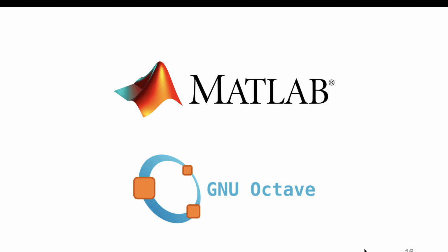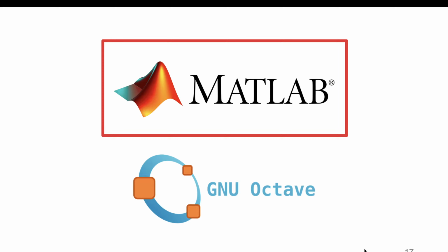To run qMRLab, you'll need either MATLAB or Octave. Unfortunately, the graphical user interface is only available on the MATLAB version. You can use the command line tools with both. For this tutorial, I'll assume that you have MATLAB already installed on your computer.